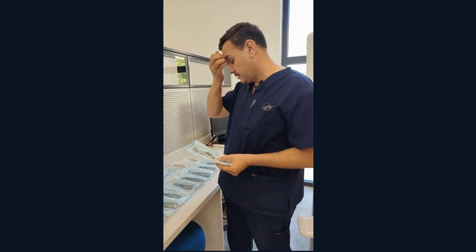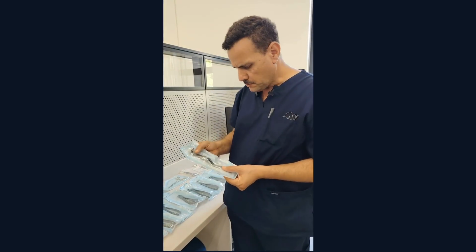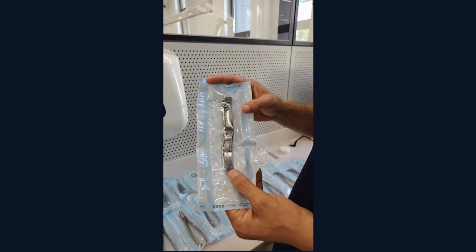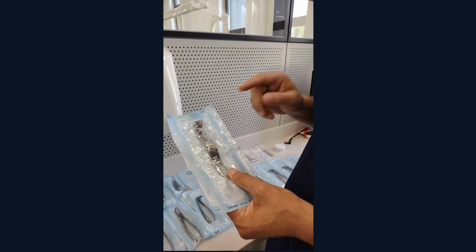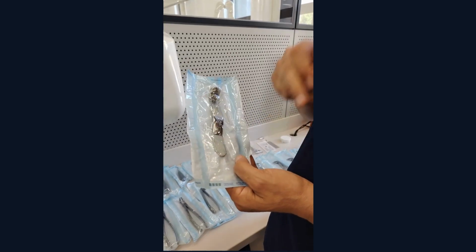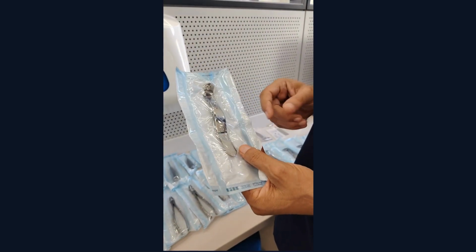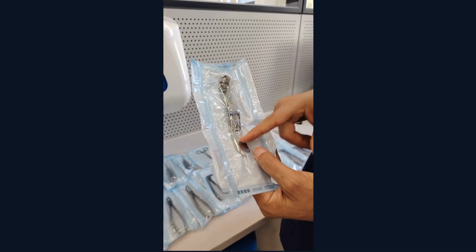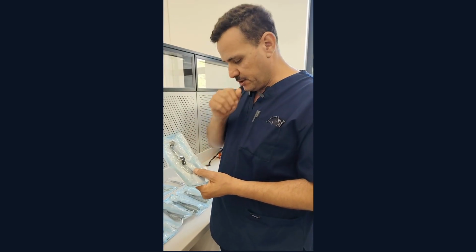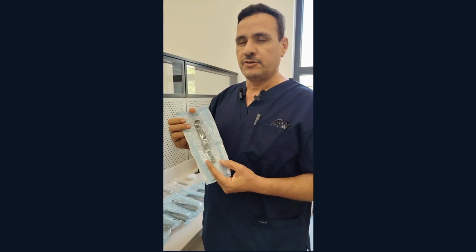All right. So we're going to talk about the basic surgical instruments that we need. So this is the Minnesota retractor. It's very useful in oral surgery. We use it as a cheek retractor and tongue retractor. Also, when I open the flap, this edge can help to protect the flap for reflection, and it's very useful in third molar surgery, especially lower third molar surgery when you have to cut the bone, cut the teeth, and protect the soft tissue. So this is the Minnesota, one of the basic retractors in oral surgery.